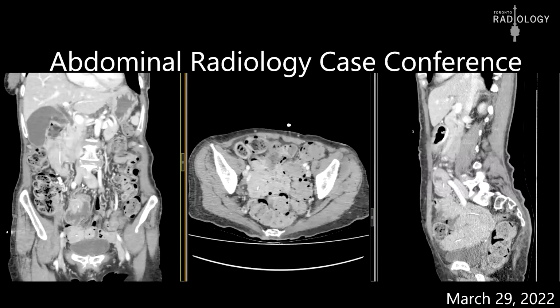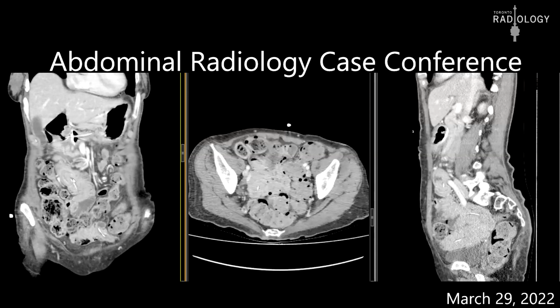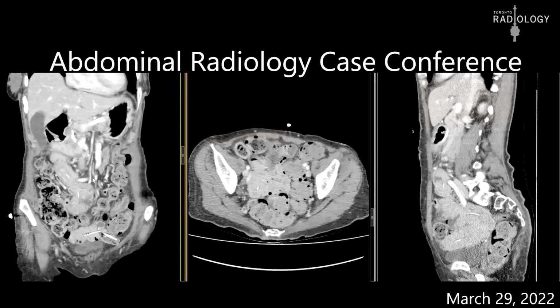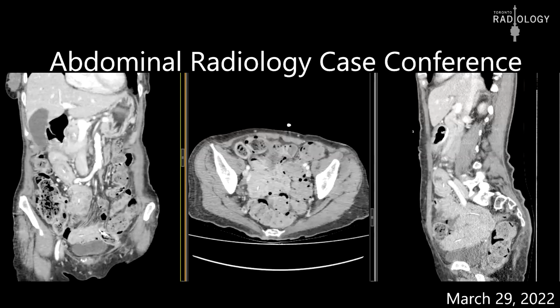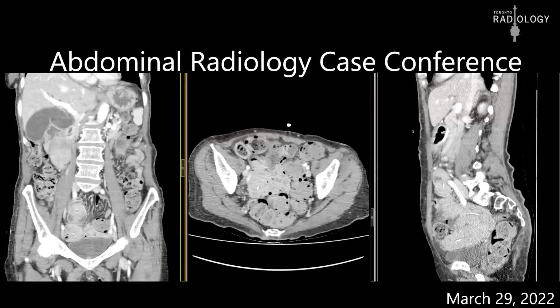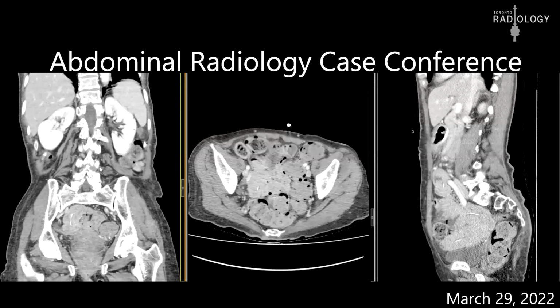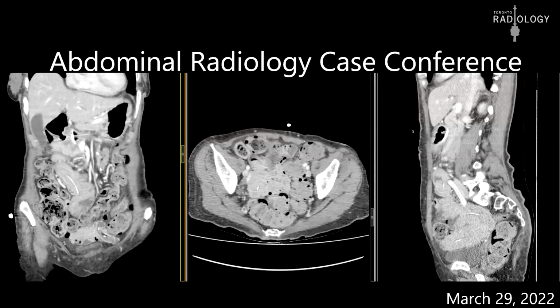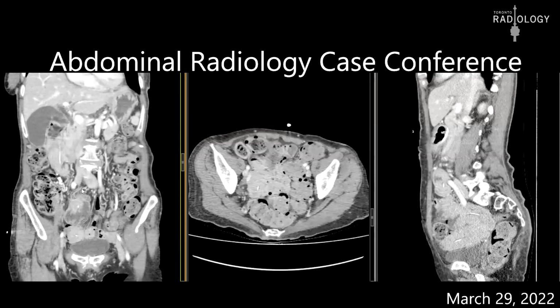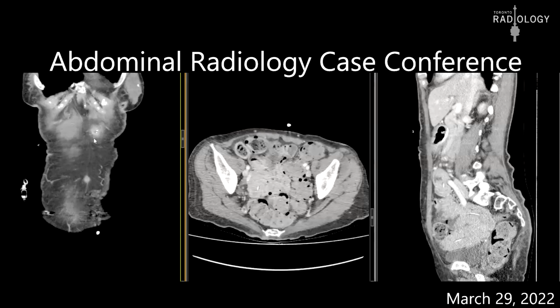First of all, this is abnormal. There's no bowel obstruction. The bowel kind of looked thickened, and my residents and the fellows thought it was probably some kind of bowel thickening of some weird nature. And then some people thought it was intussusception. These were all good points. But without knowing more of the clinical history, I thought it would be difficult to figure out what it was. So I went and looked at what this particular tube is, why it was placed and all that. It turns out that this is a Duodopa tube.